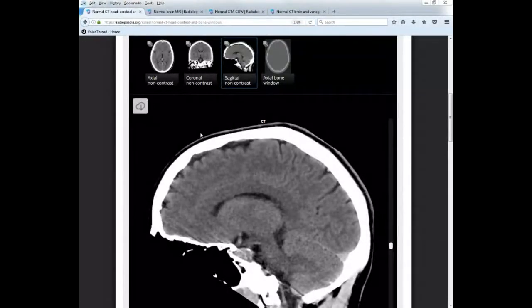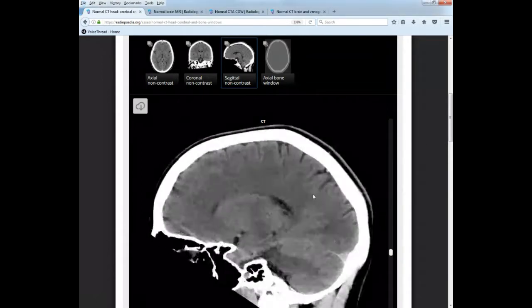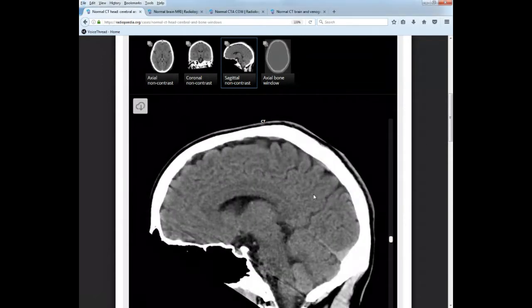All right, guys, this is the very last lecture where I'm going to show you anatomy, starting with the ventricles. So here's a CT. Again, all these are in your research helpful links in the course. This is your normal head CT link. We'll start out with this this week, and the anatomy we're going to go over today.